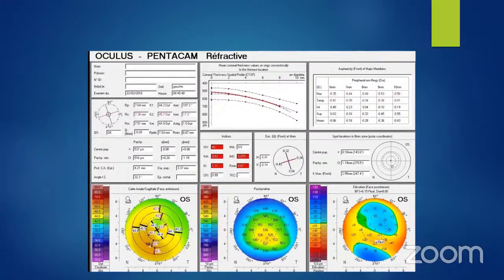What about this? So every time you may not be having the same map display. There are different modes by which you could take the printout, and the patient may get a different type of printout. So don't get thrown off, now this is not a quad map.